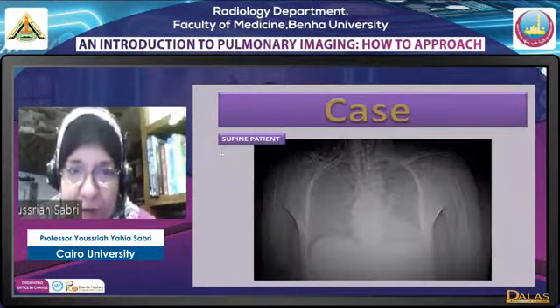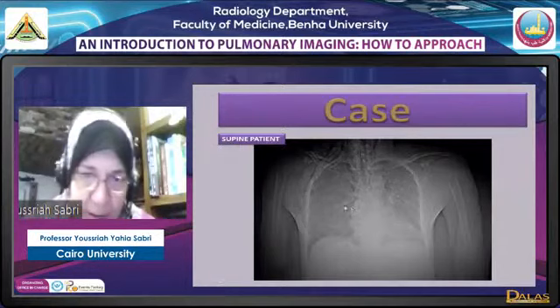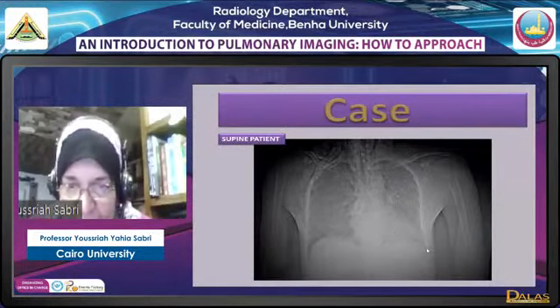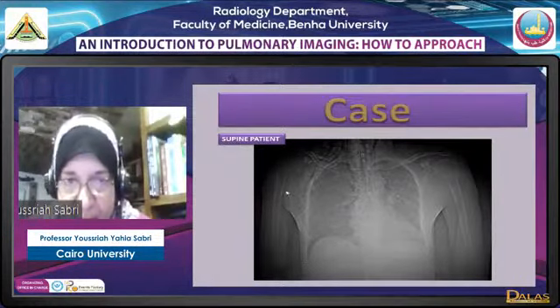Now this is another supine patient. This is a film paper, of course, the image from a paper, that's why it's not very nice. This is a normal costophrenic angle. This is the deep sulcus sign, and the patient also has surgical emphysema, as you see here.